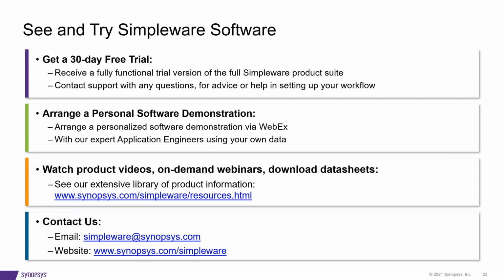That's where it ranges with what we can do, from split and merge tools and different segmentation tools that can help with semi-automating it, and then we get into things like scripting, Python, C#. Anything you can click, you can script within the tool, so you can make wizards and help people along. And that's all within Biomedical, the FDA cleared, CE marked version of the software.